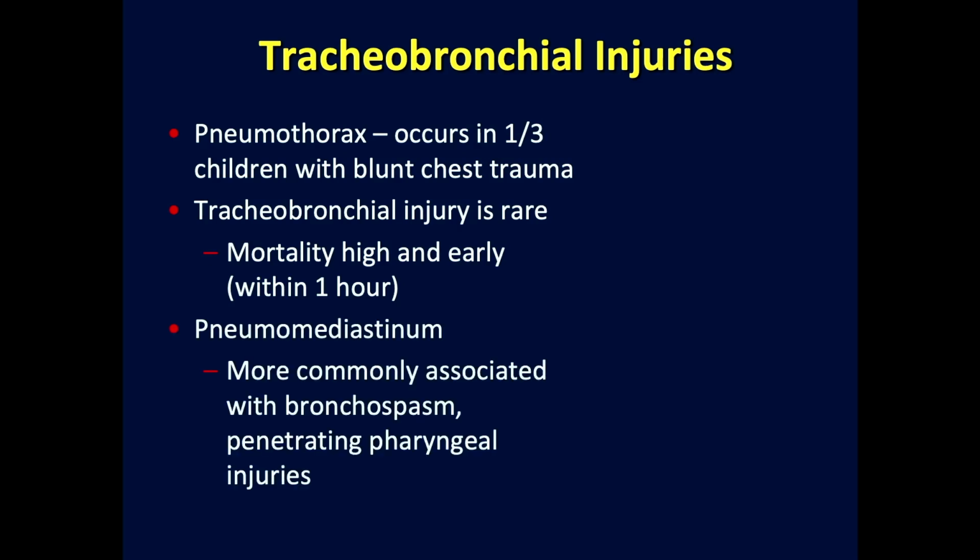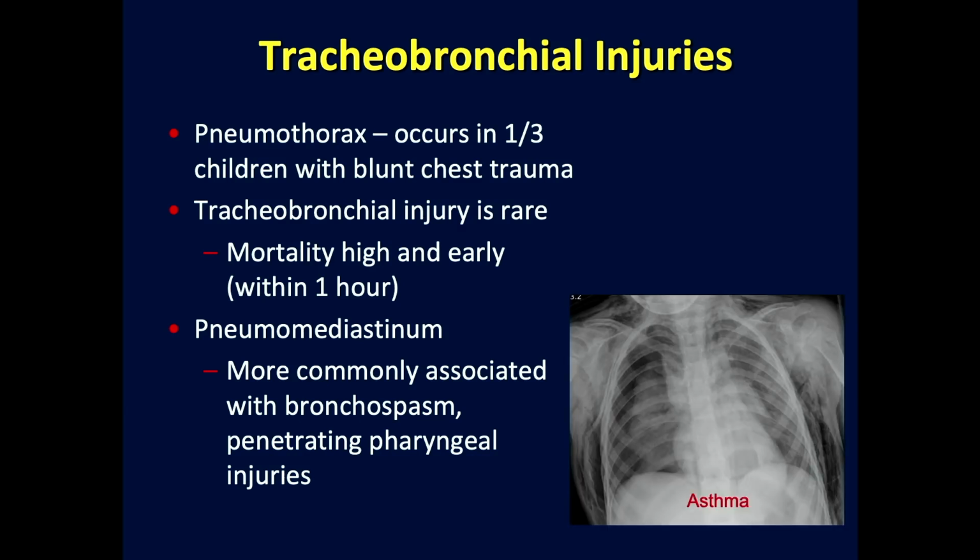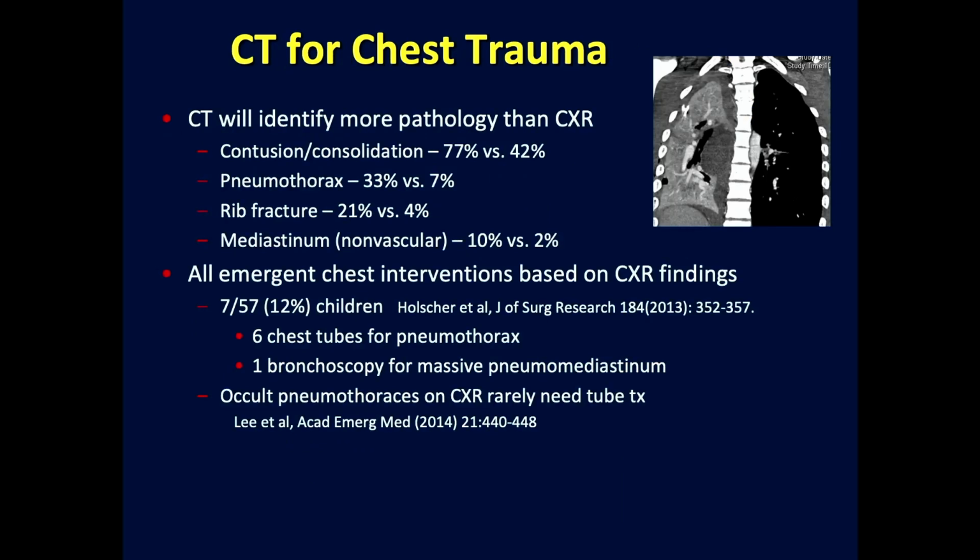Pneumomediastinum can occur related to trauma, but I actually see pneumomediastinum, particularly significant pneumomediastinum with large amounts of subcutaneous emphysema, due to other causes, either a penetrating pharyngeal injury or often in a case of bronchospasm, as in this patient with an asthma exacerbation. So not a very common component of chest trauma in children.